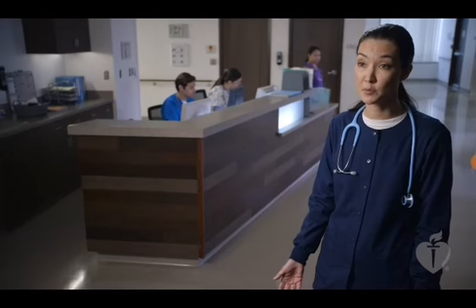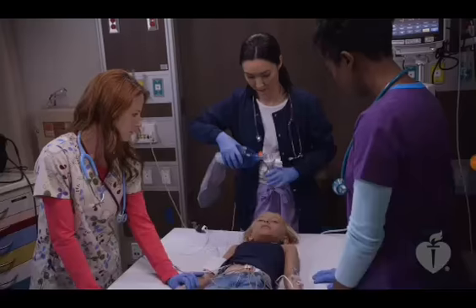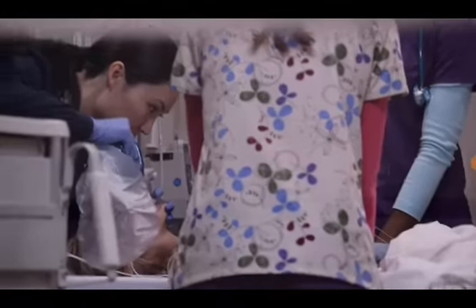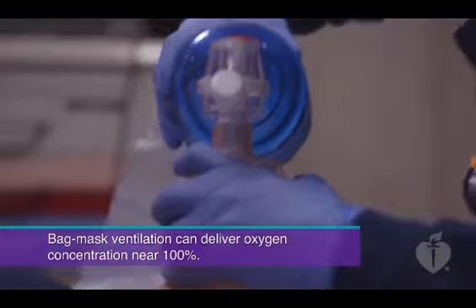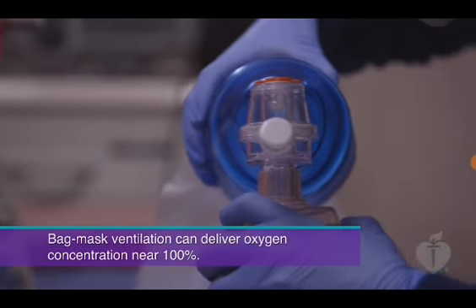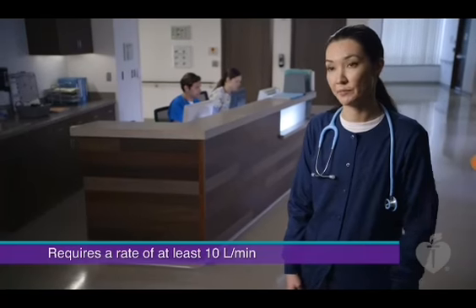In the most serious respiratory emergencies, effective ventilation may require positive pressure. In these circumstances, the use of a bag mask device is the most important life-saving skill you can perform. Bag mask ventilation using a bag with an oxygen reservoir can deliver an oxygen concentration near 100%. This requires an oxygen flow rate of at least 10 liters per minute.